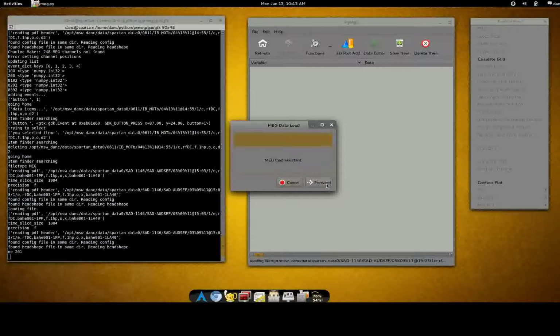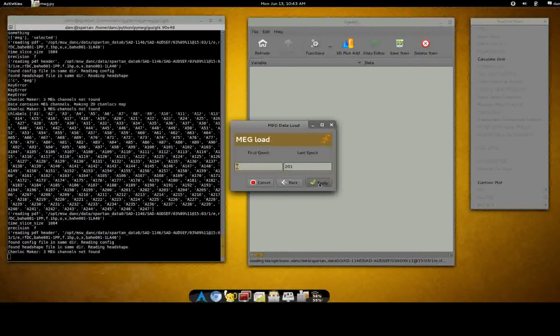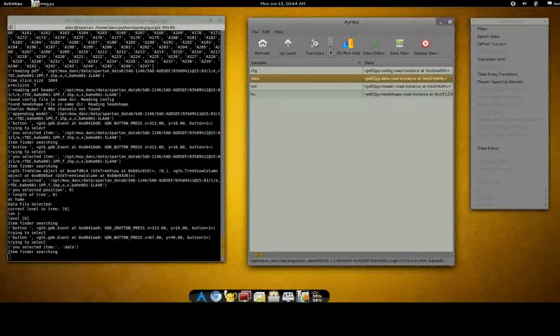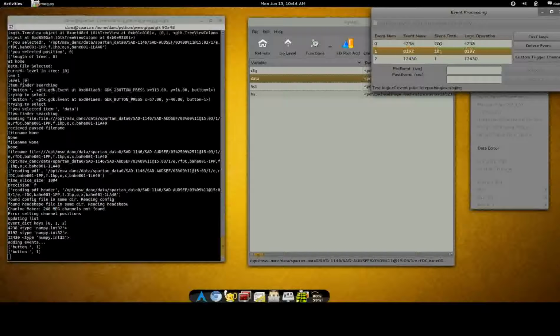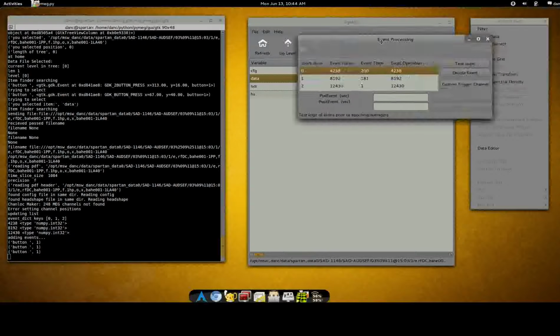This was a left ear stimulated auditory experiment. So the subject got a left ear stimulus tone every 1.5 seconds. And we want to epoch this data set. From previous knowledge, I know this is the event value, 4238.